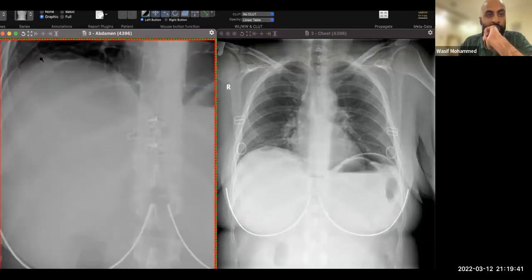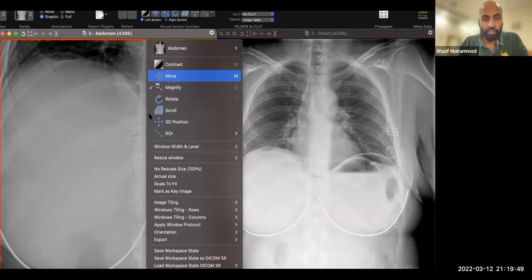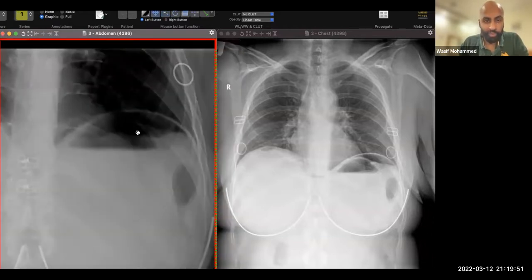All right, this is not going with the rib shadow. The rib is going like this, and this is the diaphragm. But I think it's even more clear on the other side. This is the gastric bubble, and this is the pneumoperitoneum. You either do a lateral decubitus film or a chest X-ray to further evaluate or clarify if there's pneumoperitoneum, especially if there's a clinical history that is highly suggestive. Okay.